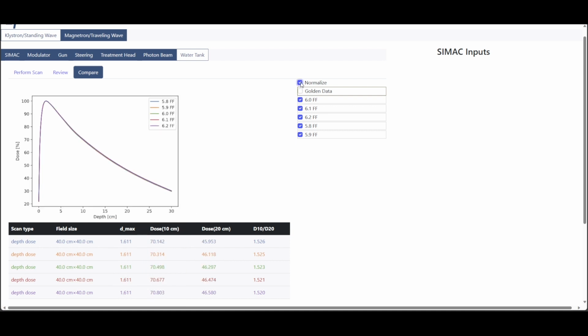Here we go. We used Simac to do an experiment to study how profile flatness can be used as a troubleshooting metric for beam energy changes. Doing so on a real machine would have consumed a lot of time, but we did it in a virtual environment. This is just a start of the results you can learn, teach, and replicate on Simac.